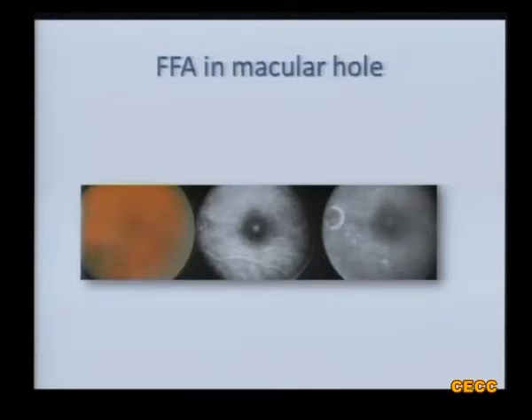It is mainly useful for imaging of vascular retinopathies, but it can also be used in diagnosis of macular hole where you are having a doubt about the diagnosis. Because when you do a fluorescein angiogram in a patient with macular hole, because of the retinal defect, you will be able to see the underlying choroidal fluorescence. It somewhat resembles a window defect. There is no increase in size, there is no leakage, and it fades towards the late phase of the angiogram.